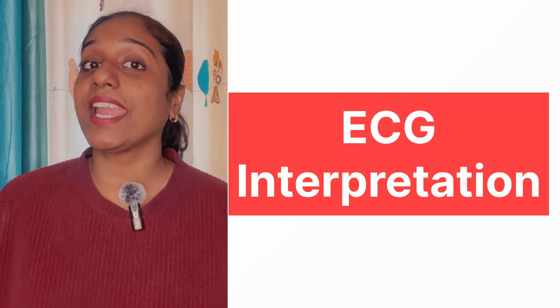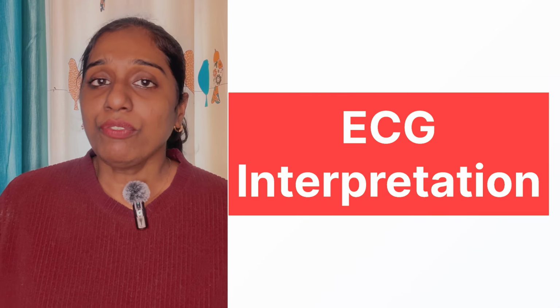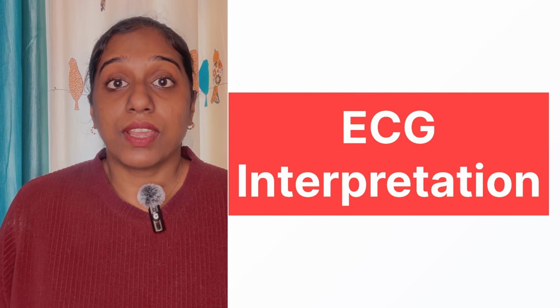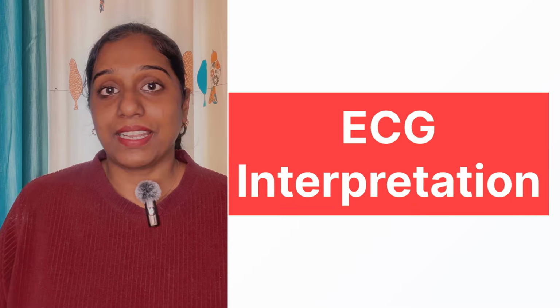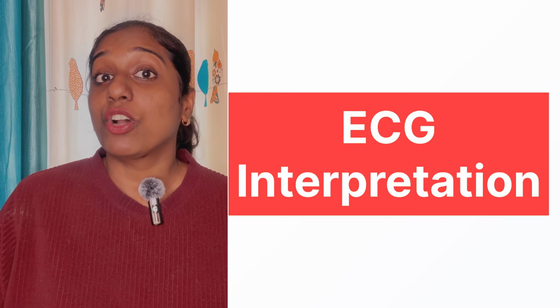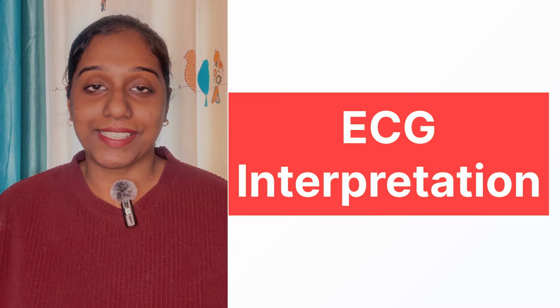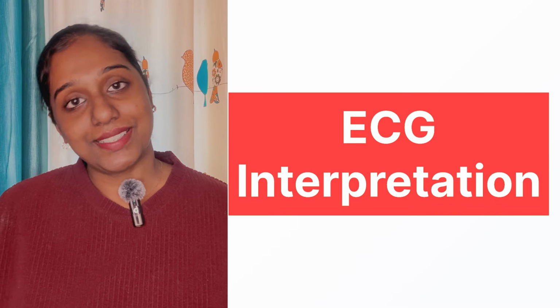Today I'm going to discuss one of the most important topics in this ECG series, that is ECG interpretation. If you find any difficulty in reading an ECG paper, or if you get confused when you get an ECG paper, then this video is for you. Watch the full video and finally you will be able to understand and interpret ECG very easily. So let's start. When you receive an ECG paper, first check for the heart rate.